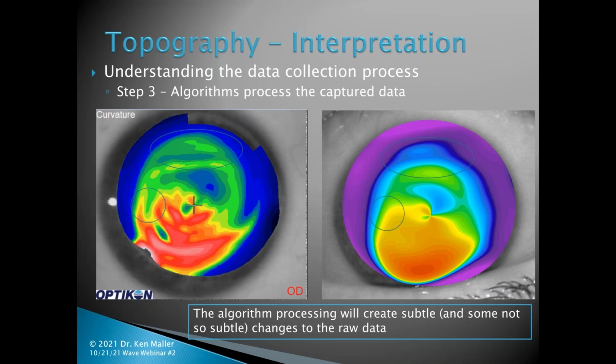These changes that we're seeing here are purely from the processing that's being done within the algorithms that process what the raw data was captured into the display data that we're trying to see here. We move up over here, and you can see once again, the scout says that the cornea is a little bit steeper in the middle of that circle than the pentacam says.